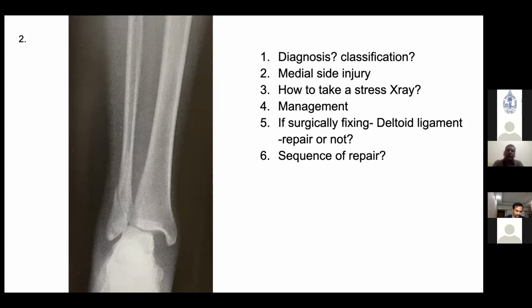Yes, the fracture line goes from medial inferior to lateral superior. In pronation external rotation, the fibular fracture is usually suprasyndesmotic. So this is a supination external rotation injury because the fibula has an oblique fracture from inferior to superior, and there is widening of the medial joint space.